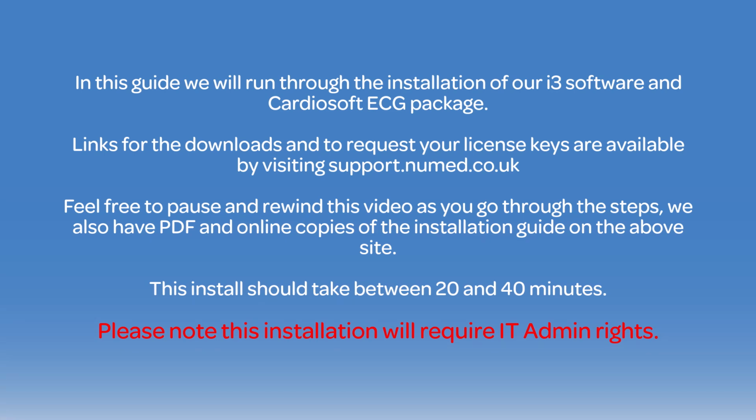This install should take between 20 and 40 minutes. Please note, this installation will require IT admin rights.